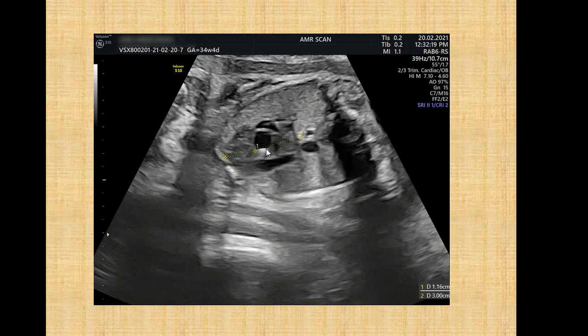You will consider a chromosomal anomaly if it is slightly less than 30%, and 22q11 if it is smaller than 20% of the thoracic ratio. This is the thymothoracic ratio, measured from the sternum to the anterior border of the aorta, and from the sternum to the anterior body of vertebra.